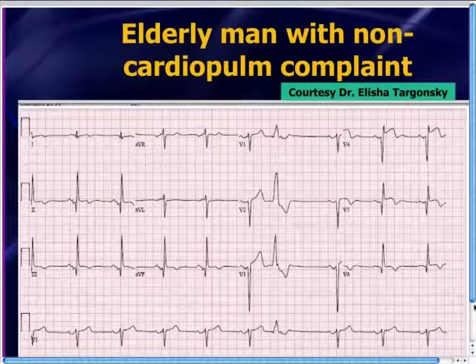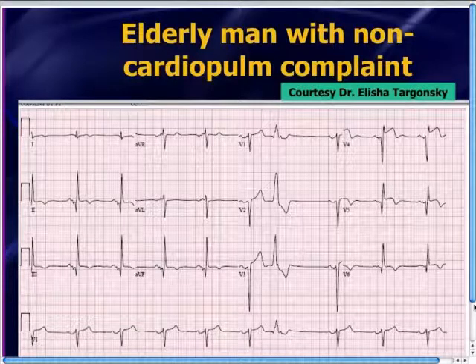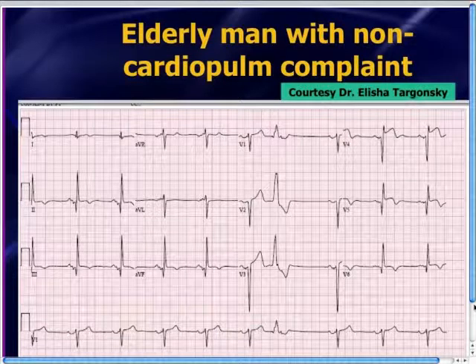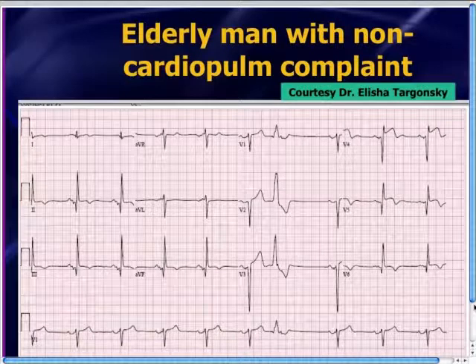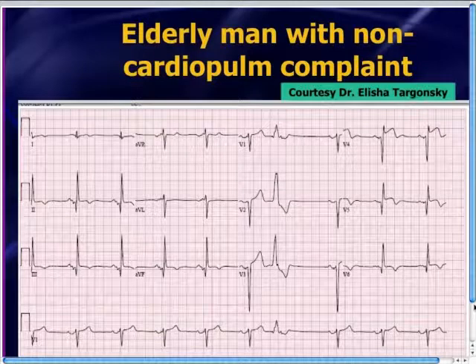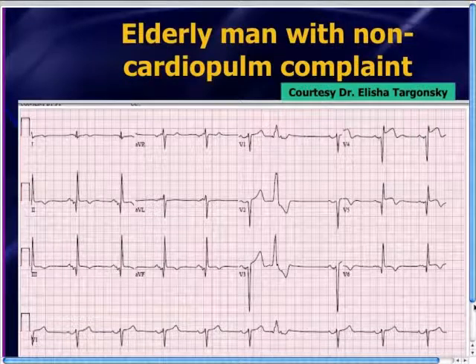In this particular case, the patient's presenting not really blowing your socks off in terms of worry by history of ACS. But then you get a 12-lead EKG, perhaps for some type of pre-op evaluation, and the EKG is kind of blowing your socks off because it's really, really concerning, right? What you're looking at on this 12-lead EKG, you've got a person who looks for all the world like he's having an acute anterior wall STEMI.